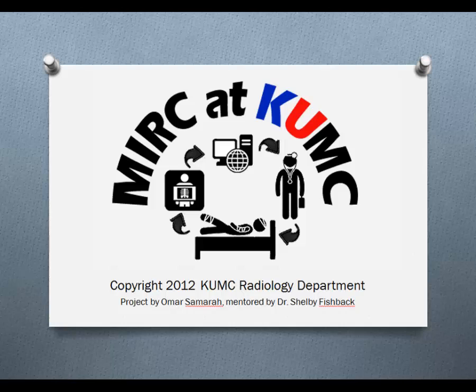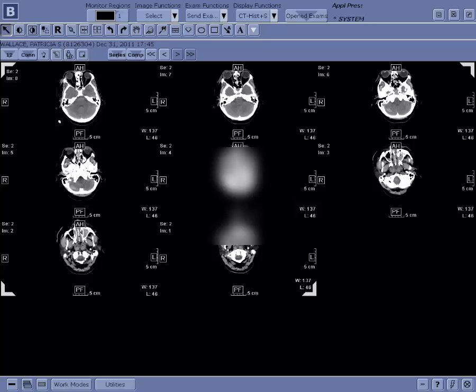There are currently 3 ways to get images into MIRC: sending them from PACS, importing them from your desktop, and sending them from a film digitizer. The goals of this tutorial are to send images from PACS, import images from your desktop, and send images from a film digitizer. The first topic is sending from PACS.